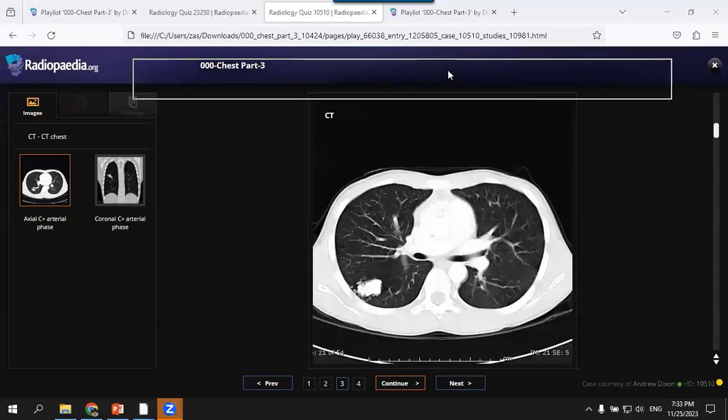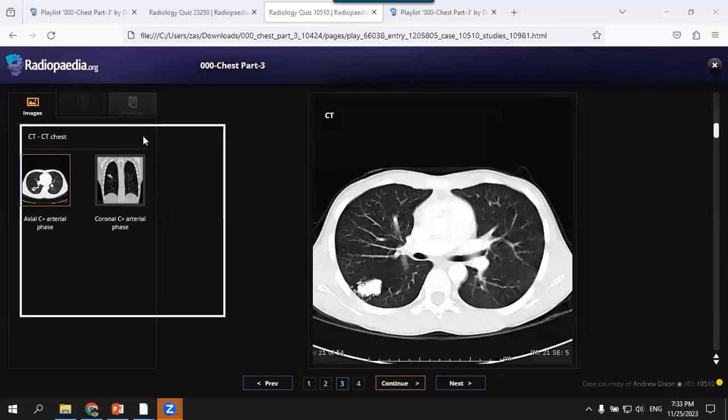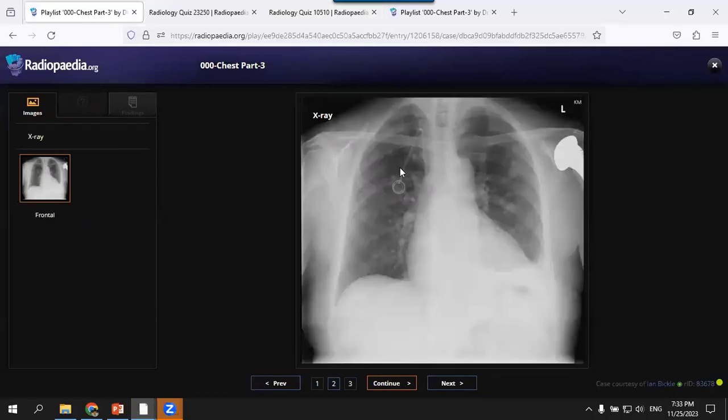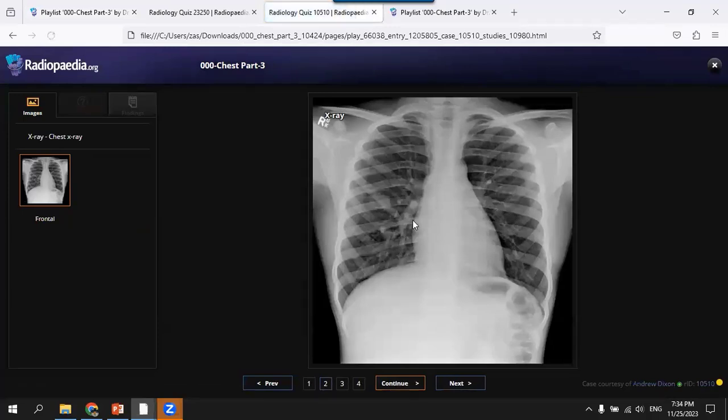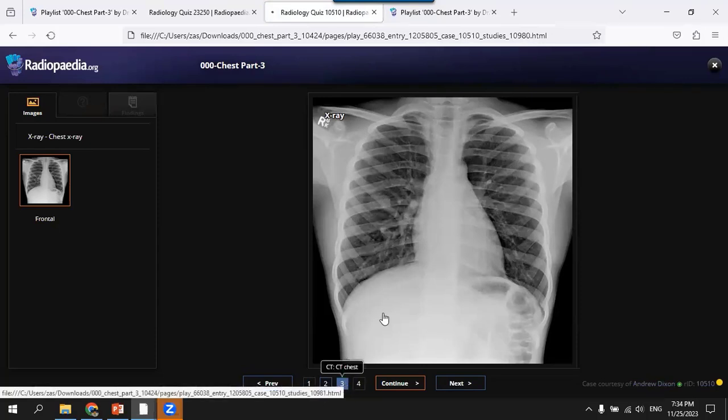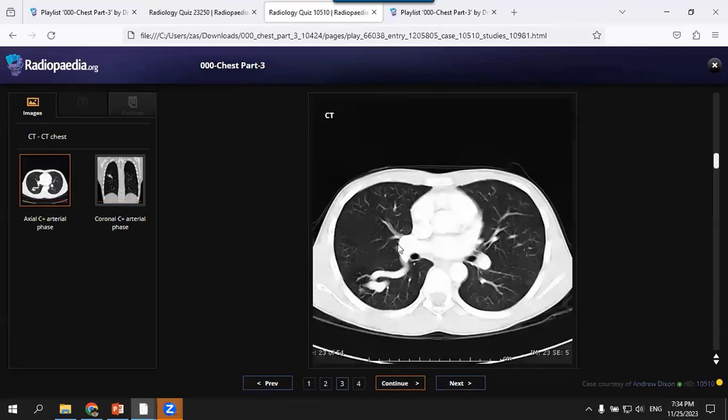In multiple lung nodules, look for a clue. Maybe a central venous line, endotracheal tube. This may be septic emboli. Central or tunneled venous line with lesion in the bone, maybe metastasis, or surgical clips. And also in this case, a feeding vessel sign may be the clue, like multiple arteriovenous malformations.